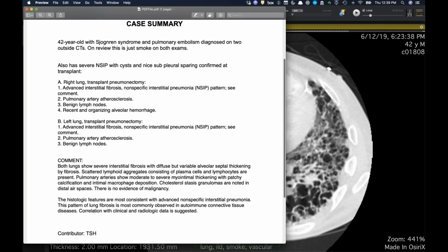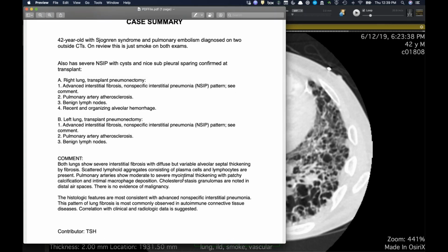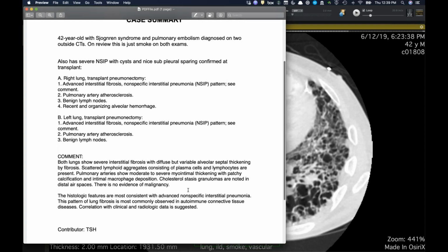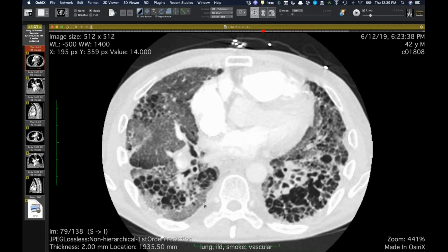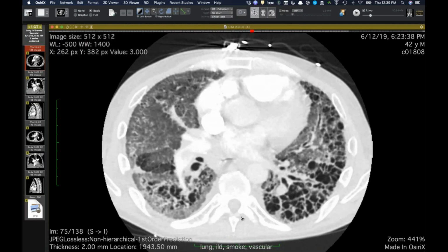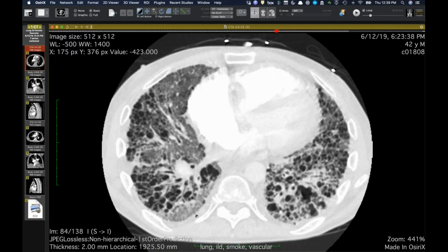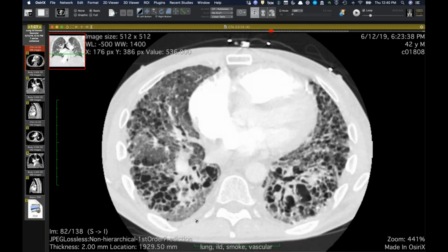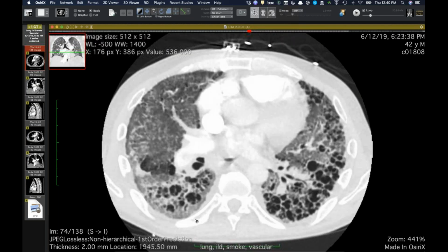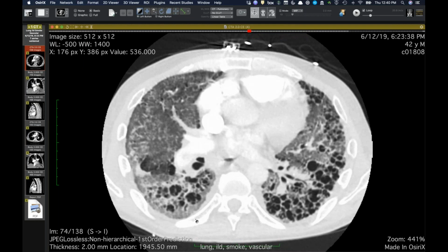There's also a little bit of hemorrhage, but they didn't comment on any thromboembolic events. When there were the 3 categories, UIP, possible UIP, and inconsistent, this was definitely not possible UIP. You either call it inconsistent, or if you think it's honeycombing, consistent. This is inconsistent for these reasons, and supported by pathology.